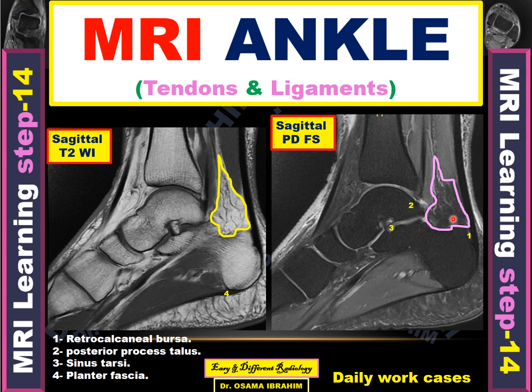This fat between the calcaneus, soleus muscle, and the posterior aspect of the talus and tibia represents Kager's fat pad. Kager's fat pad is a very important structure in the ankle, as if it is disrupted or stranded, it represents hematoma or collections or a tear in the surrounding structures or a subtle fracture also.